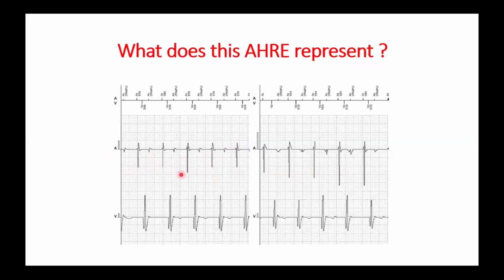Okay. Here we can notice the atrial EGM shows two different deflections.